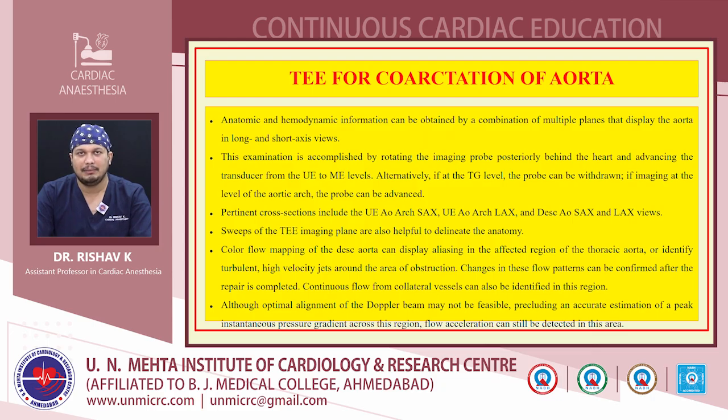Pertinent cross-sections include the upper esophageal aortic arch short axis view, upper esophageal aortic arch long axis view, and descending aortic short axis and long axis views. Sweeps of the TE imaging plane are also helpful to delineate the anatomy.